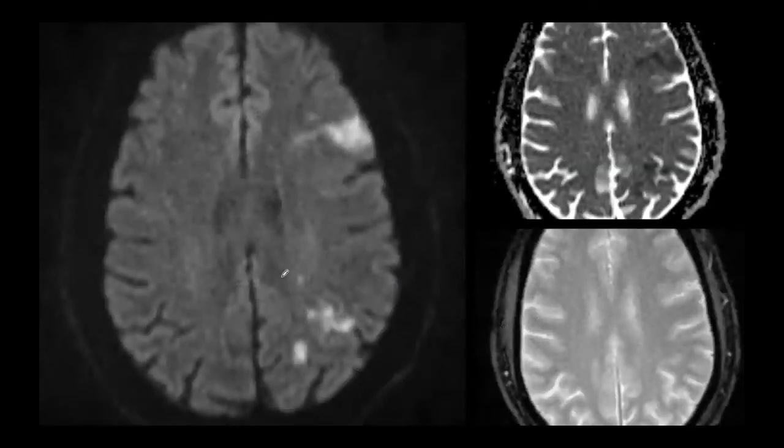And then we got the MR, and we see these findings. Now I think all of us are comfortable with calling this restricted diffusion, right? It's hyperintense on DWI, hypointense on ADC. We're going to call it restricted diffusion. It is in the region of the anterior aspect of the left frontal operculum on the frontal lobe. This one is a lot more along the posterior aspect. It's in the region of the parietal lobe.